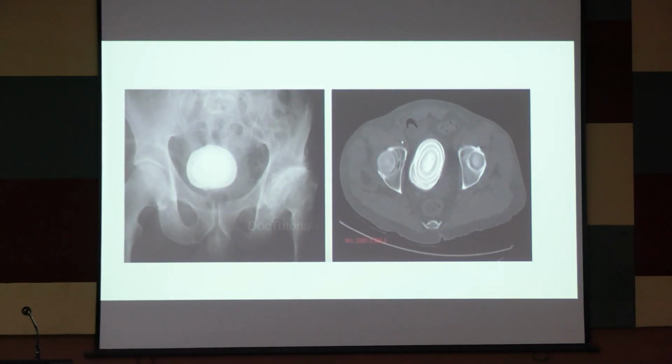Many more slides are there actually, interesting slides. Okay, let's leave off with this last one. What is this? This is the bladder, that's good. And what is this? What is this? Is this a contrast?